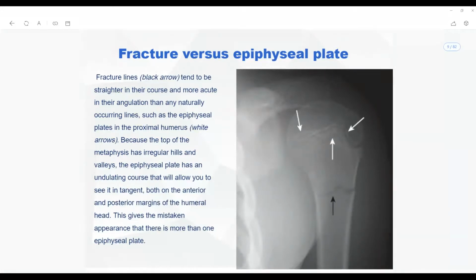In this picture, can you see any soft tissue swelling or disruption of the contour of the cartilages? Are there any disruptions of the cartilage edges or the soft tissue edges of the humerus? Is there any sign of swelling as hypodensities along the soft tissues? No. So that is not a cartilaginous thing.